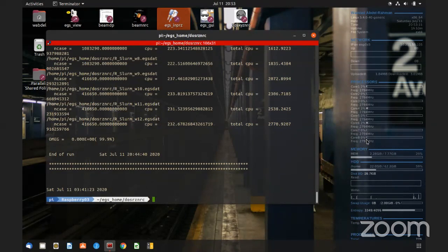More about how to continue with the interrupted sync. I told you, you need to create the files. You need to go into these directories, get the files, and then restart.